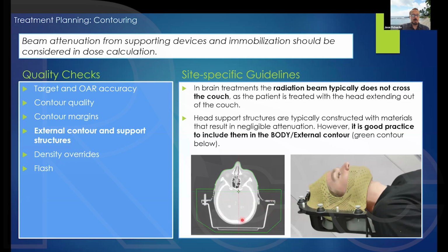A very easy way to do this, and it's very important, I should mention: you could say, why don't I just draw a blocker on the patient and be done? Yeah, okay, you could do that for dose, it's fine, right? The problem is if you're using surface guidance, you need to be able to see the outline of the face of the patient. You need to see the nose. You need to see all this topography, right? So you don't want this inside of a big block. Otherwise, you can't set up the patient with surface guidance, right?